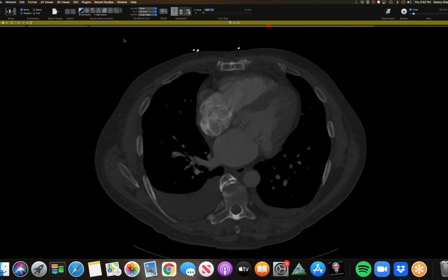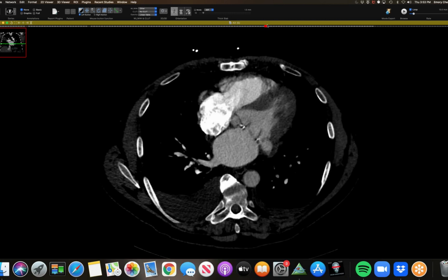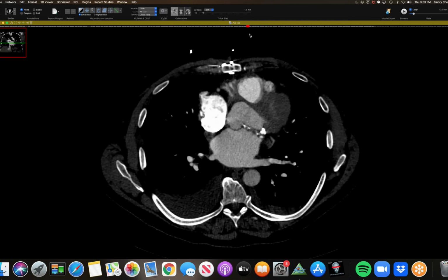This is a quick one, just a case that could easily fake you out. So here's a patient, and just looking at the heart, there's this pocket right here, and it looks like a little subvalvular aneurysm. But if you look, the valve has been replaced, but there's a lot of calcium right around the annulus.